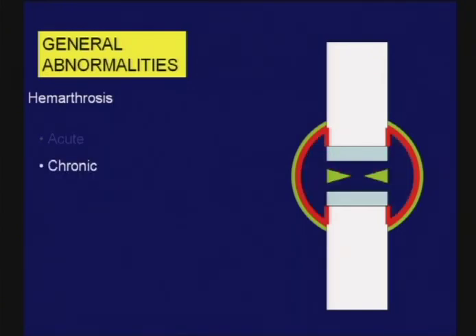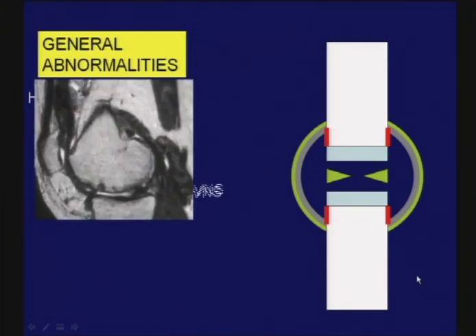In the chronic stages of a hemarthrosis, there are some specific MR imaging features that allow us to suggest chronic bleeding has occurred. The major one of which is darkening of the synovial membrane owing to the presence of hemosiderin deposition. This is an example of a young adult with monoarticular disease of the knee, in which we can see extensive infiltration and dark signal within the synovial membrane of the joint, as well as within a small popliteal cyst. Based on age and the fact that this is a monoarticular process, the best diagnosis is pigmented villonodular synovitis.